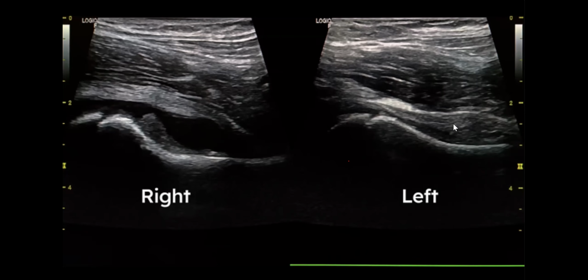This one maybe is just the capsule. And this is a capsule. Okay. So this one is asymptomatic. This one is asymptomatic. So clear joint effusion. How to deal with this case?